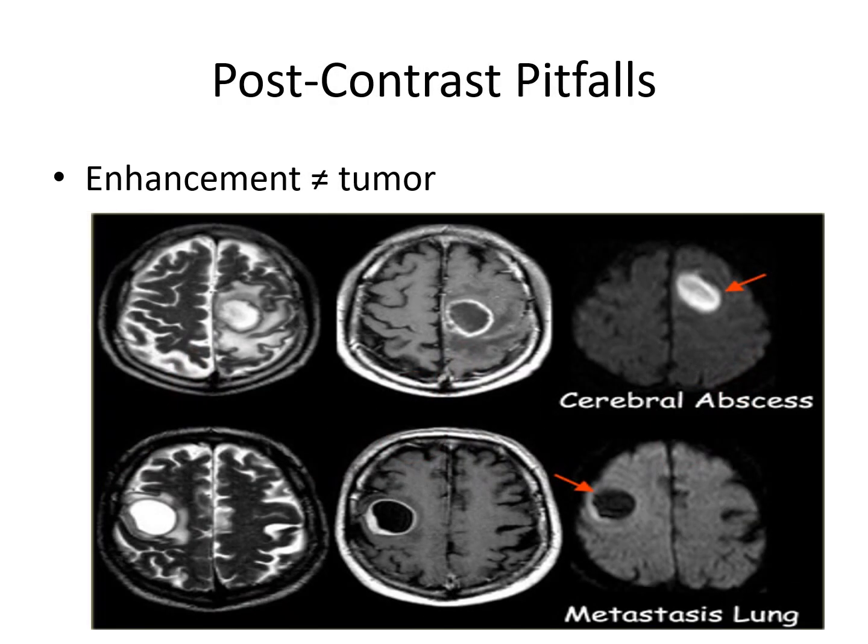Another one is the post-contrast pitfalls. Contrast enhancement is not always a neoplastic lesion or metastatic lesion. Inflammation, infection and neoplastic lesions all three show enhancement. So assess the pattern of enhancement, and clinical history is also very important for the diagnosis. And also correlate with the other MRI sequences including DWI and MRS.